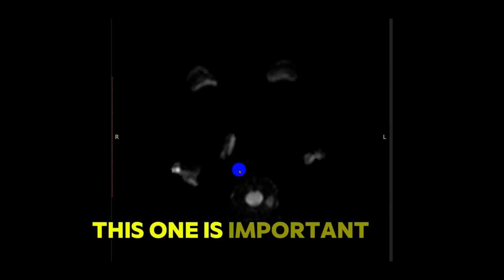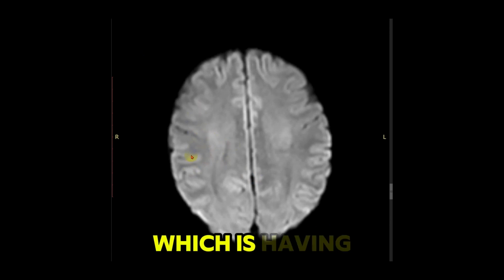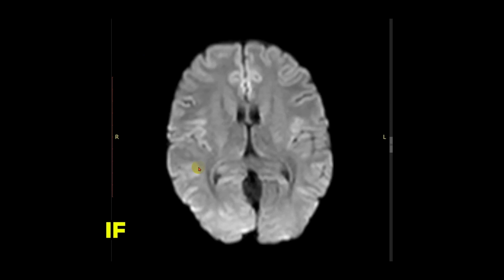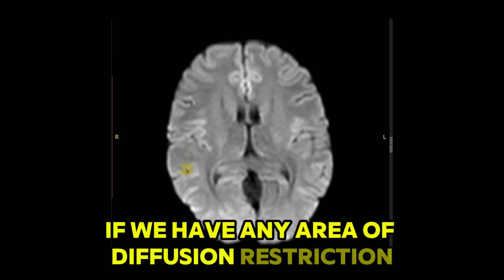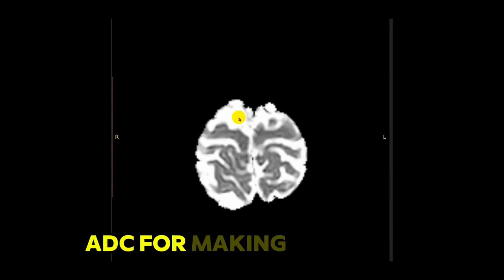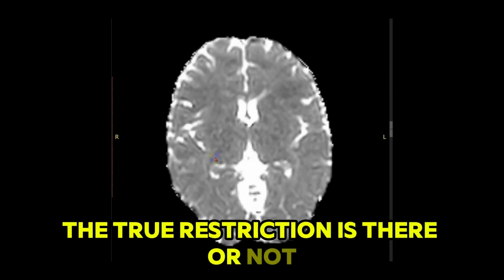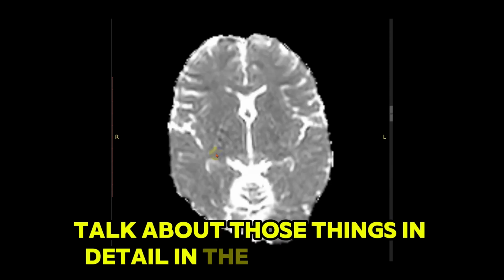This one is important to assess whether there is any area which is having restriction of diffusion. If we have any area of diffusion restriction, we will see it as a bright area here. We will have to compare with the ADC for making sure that true restriction is there or not. So I will talk about those things in detail in later videos.